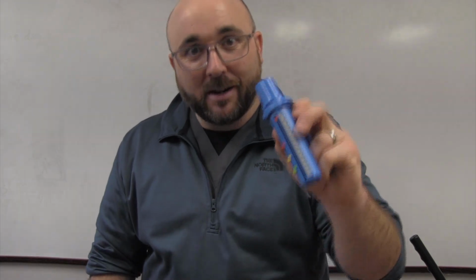You see a peak flow meter, asthma. Peak flow, asthma. It's not peak flow for all lung problems. It's not that. This is for monitoring asthmatics. And the asthmatics out there are saying, yes, that is what it's for.